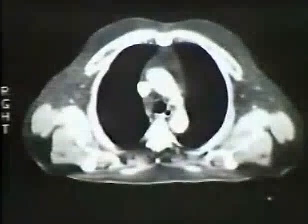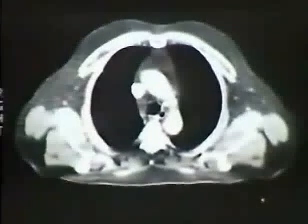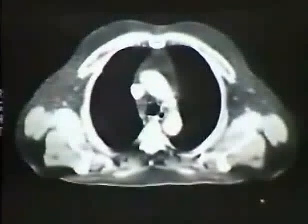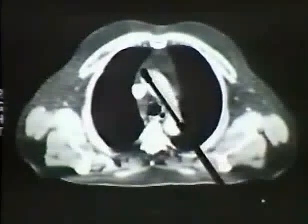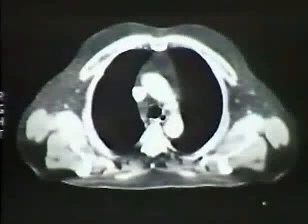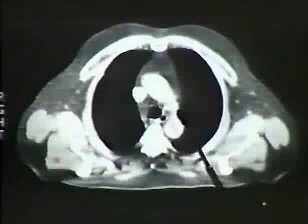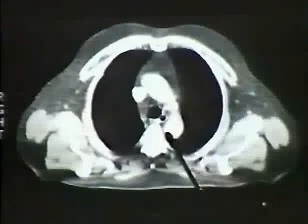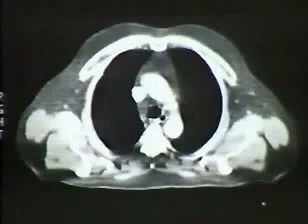Here's a CT scan as we come down to the bottom of the aorta, and here are the calcifications within the plaques that mark the arteriosclerotic change. Notice superior vena cava. Over here, this aorta is sufficiently tortuous that it's actually come anterior and may, in fact, go so far in some patients as to become border forming on the right side of the mediastinum. Notice the esophagus, with its air bubble and tissue, have all been pulled over toward the left side by the tortuous aorta, which, as you see in this patient, is way back alongside the spine. A normal young adult would have an aorta more in this position right in front of the spine.